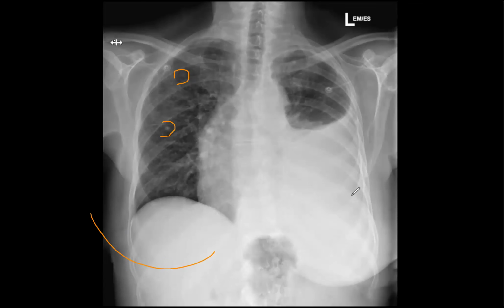Good. So in this case, comment on pulmonary nodules, comment on the ribs. I'm looking for any erosion in the visualized bones. I'm not able to see any bone erosion. Anyway, I will proceed further with a contrast enhanced CT scan of the thorax, and also a staging CT of the chest, abdomen, and pelvis.